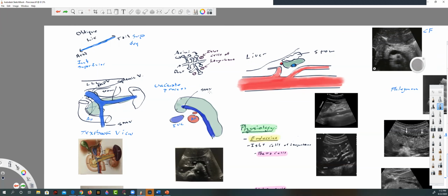So anyways, SMV, how about this? I'll do SMV/confluence. I'll just do CONF. SMV/confluence, but we'll circle the SMV because that's what the book is saying. Okay. I'm going to get rid of this guy there.